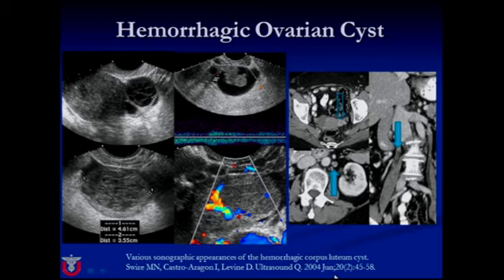In this case, you can see that there is a lumpy nodular mass inside this cystic component in this ovary. That's atypical for hemorrhage. Hemorrhage usually makes linear interfaces, but there was no internal flow. There was acute onset of pain. There was flow in the periphery of this ovary. So we decided to wait rather than intervene. And in fact, 6 weeks later, this was completely resolved, and it was indeed an atypical hemorrhagic cyst without evidence of torsion.